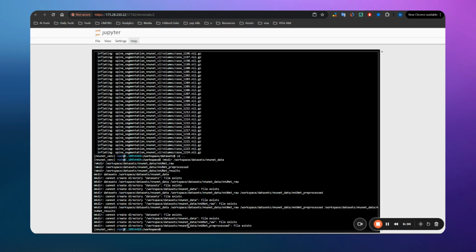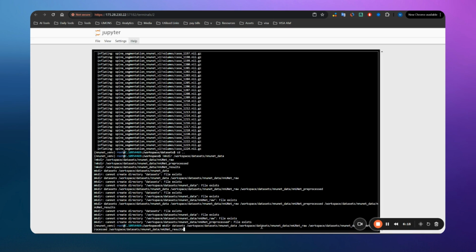Now let me just create them. Sorry, I am just editing because these commands have been used in my notebook, and for this reason they seem to have the other sign. Let me just correct this.